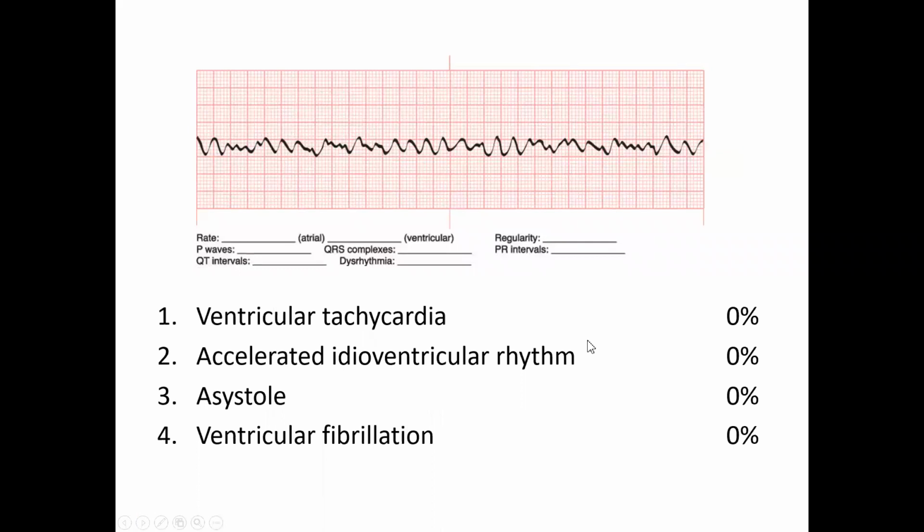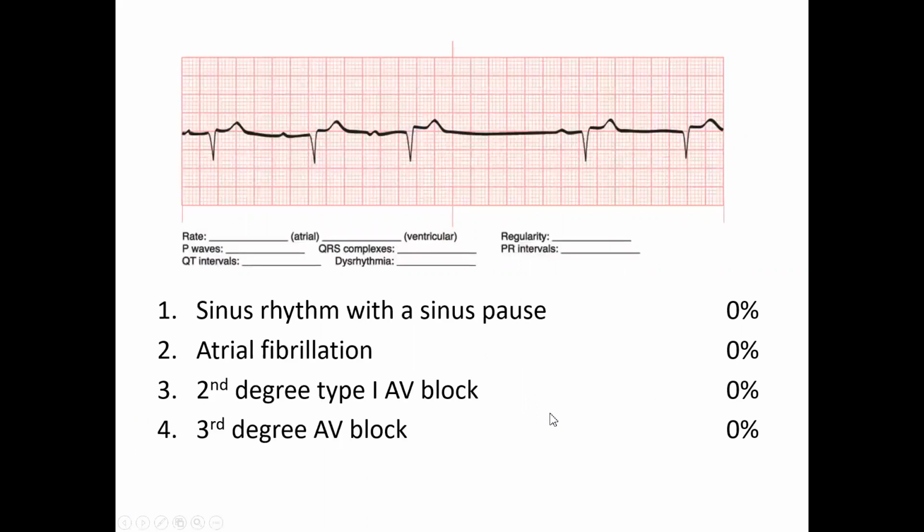This is ventricular fibrillation. So this is what you get with ventricular fibrillation. You have to start high quality CPR, get chest compressions going with the individual, and then defibrillate as soon as possible, because you always defib the VFib. It's just not a good thing to be in.